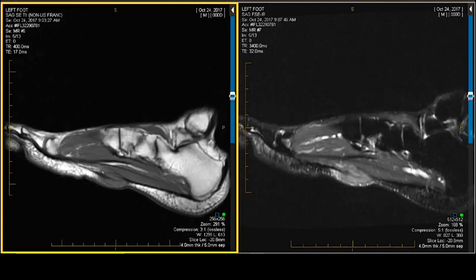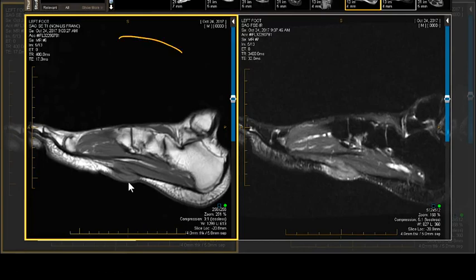But when you have these linear streaks, when you have something that looks like this, almost like a corduroy effect, that tells you you're dealing with something fibrous or the family of desmoids. Now, this is considered a low-grade, non-aggressive type of fibrous lesion. That's why it's called non-aggressive fibromatosis. That's why we don't use the term desmoid, although it's a benign desmoid. So is Dupuytren's contracture of the hand. About 25 to 30% of these patients will have Dupuytren's contracture of the hand.